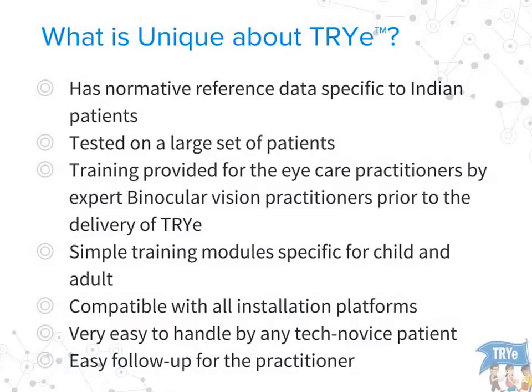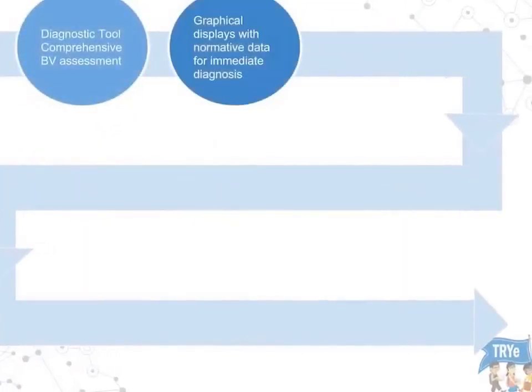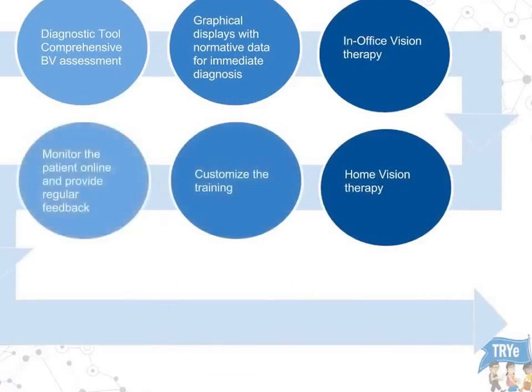We have simple training modules incorporated within the program that are specific for the patient, whether they are kids or adults, as well as for the practitioner. And as I already told you, it is compatible with all installation platforms and it's very easy to handle by any tech-novice patient. So this is just a quick outlook of what TRYe has to offer in a nutshell.